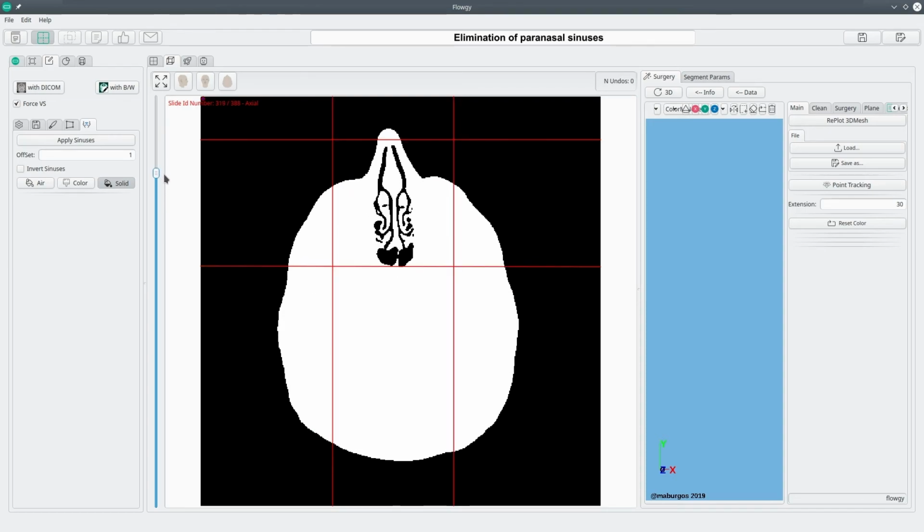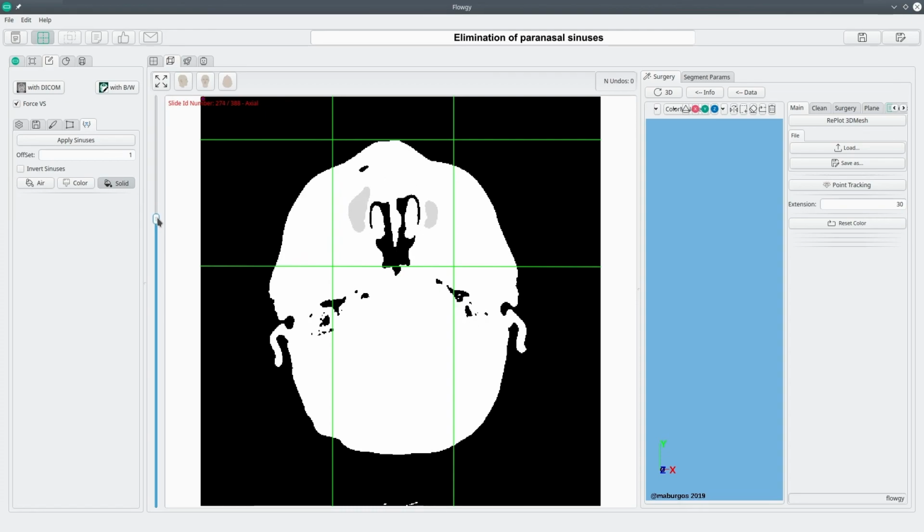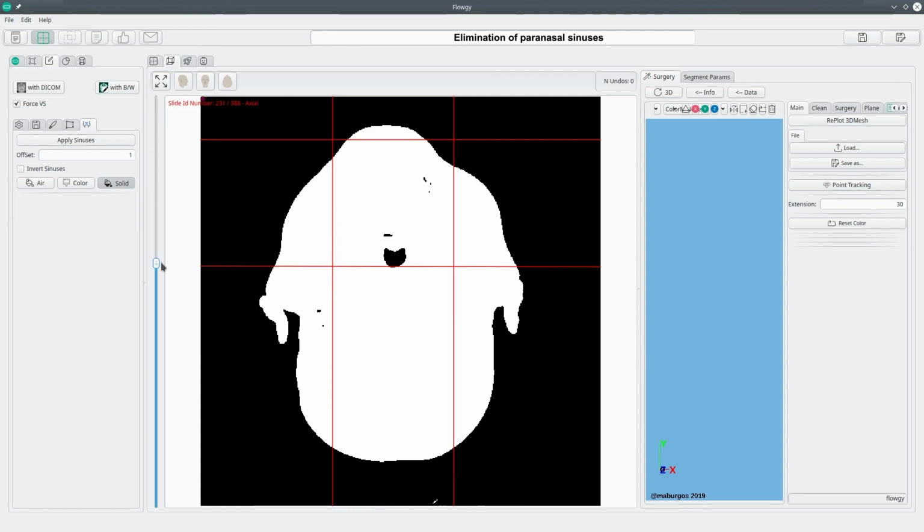Also, you can see that only the gray areas are in the range we selected. So if we go out of our range from the images, this box goes red, so this is not really affected anymore. We are now in the green area where it's affected, and we go out again here.